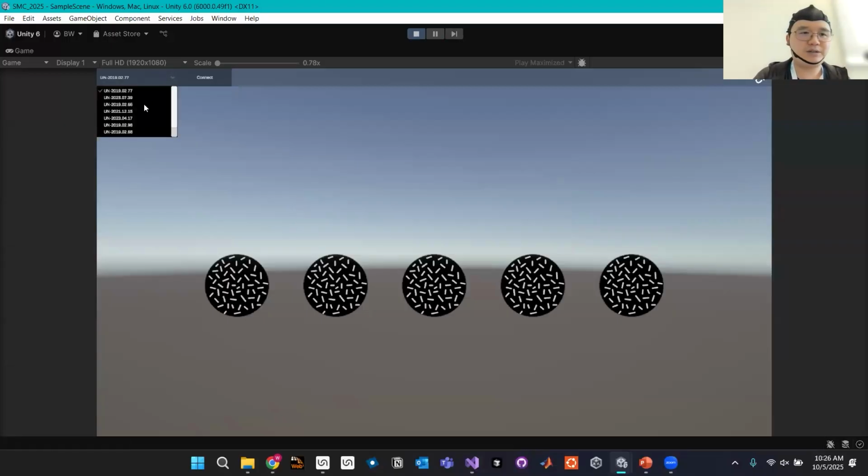And then you can just select your serial number. So here I have a lot because this is the development laptop I have in g.tec, but this is the version of the Unicorn that I'm wearing. But at the moment, I will just show you with the Unicorn 0.000.00.00. So that's the simulator.